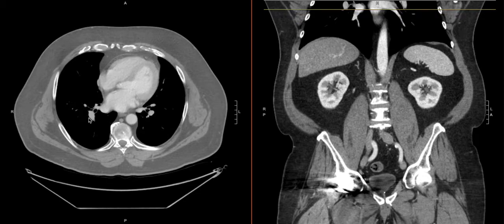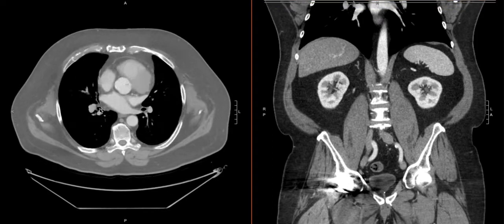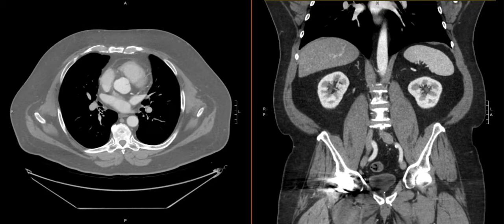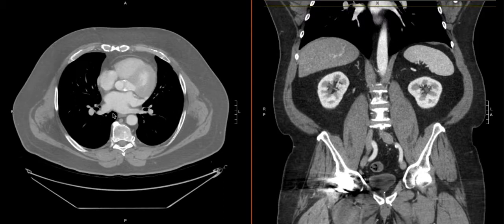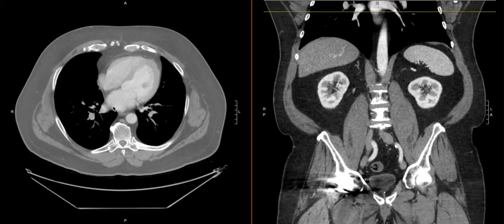Here we're looking at this branch that's coming off here. And then we can look at this more anterior branch that we partially get a cut of. Just looking for filling defects in the arterial system. Make sure to not confuse the venous return, such as these vessels here that are coming back to the pulmonary vein on that side, with the pulmonary artery.